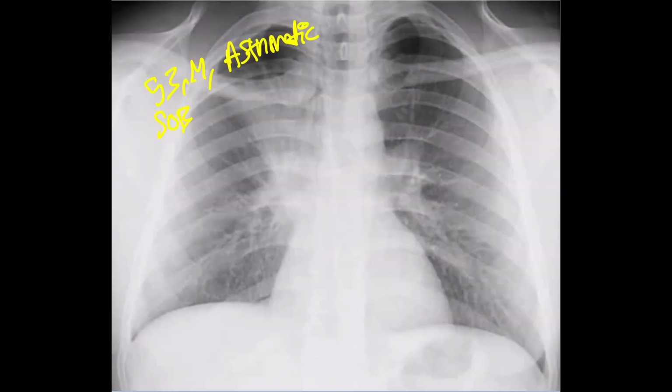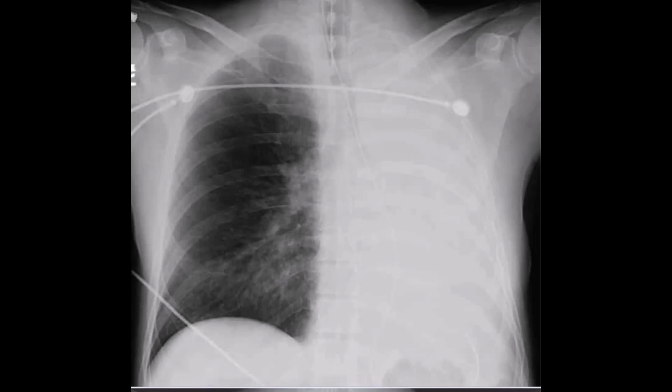So this is the chest X-ray of a 53-year-old male asthmatic presenting with shortness of breath. What do you think? There's a triangular suspicious opacity in here with a minor shift of the lung fissure, the minor fissure, pulled upwards because of the atelectasis. So this is atelectasis. And this is associated with a slight shift of the trachea to the same side as the atelectasis, to the right side.